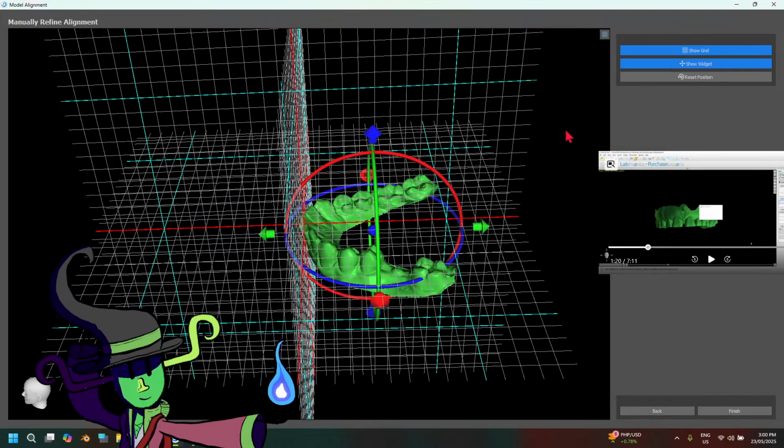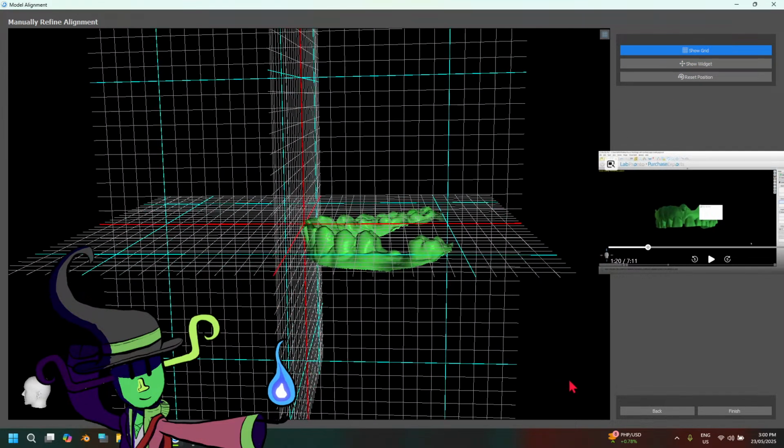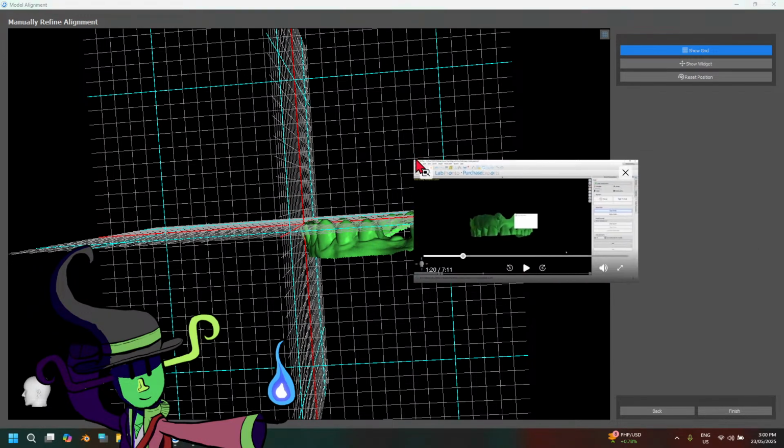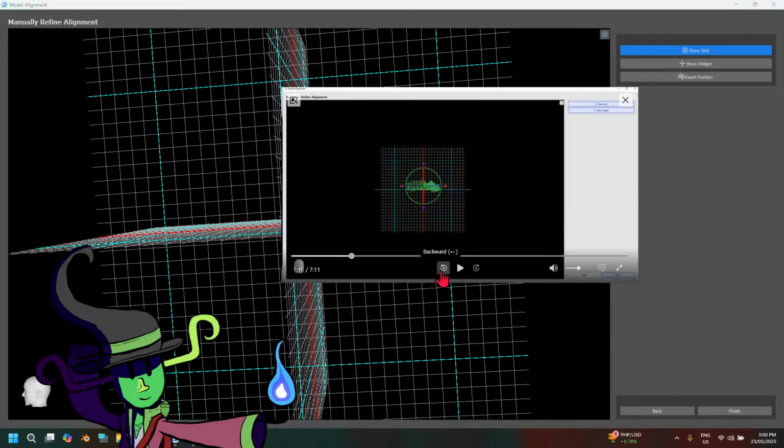Wait, it's doing the thing. Wait. How did he? Why is there no way for me to?